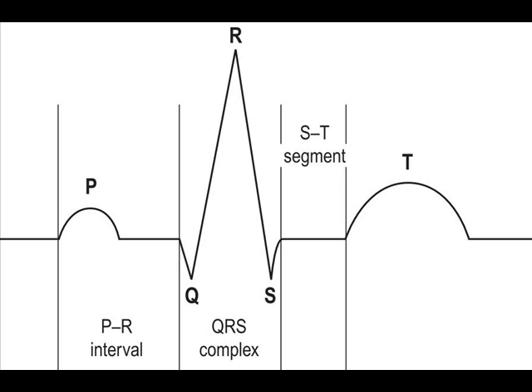If the PR interval is consistently longer, this could possibly be first-degree heart block. And the PR interval equates to problems with the atrioventricular node. And if it is first-degree heart block, it means that the AV node, or the atrioventricular node, is holding up that impulse a little longer than it should do. Usually it's nothing serious and the patient will not normally be hemodynamically compromised.